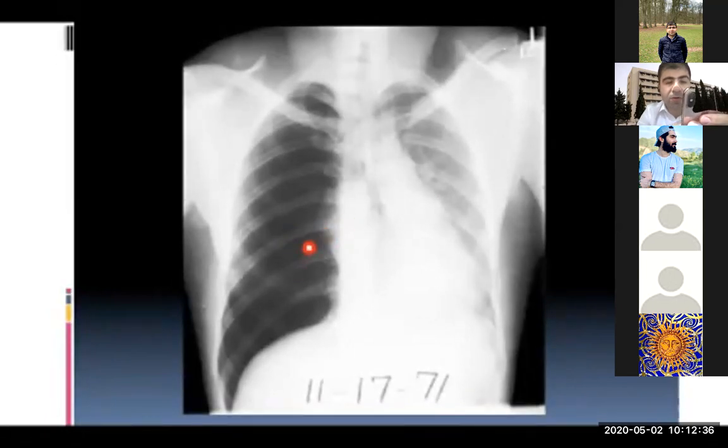So bronchovascular shadowing, you cannot see it on this side. But on the left lung field, you can see it; this is normally seen, but usually you will not see it until the periphery, but at least in the midway you see it. So this is a normal bronchovascular pattern.